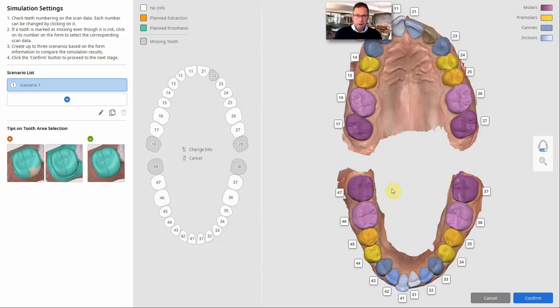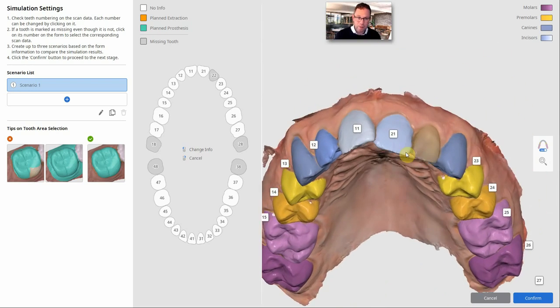It's a treatment planning, or it gives you access to, in a very, very simple and easy way, treatment planning, so that your simulation is not just a really basic computer simulation. It can be a very, very precise, very in-depth simulation, almost treatment planning. So the segmentation has been done, and this is really, really cool.